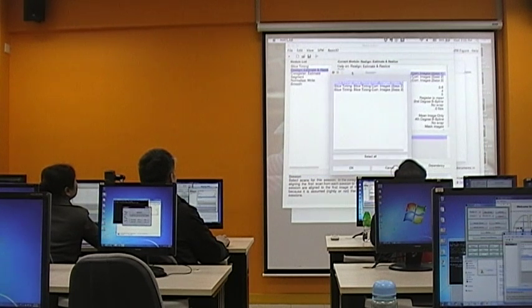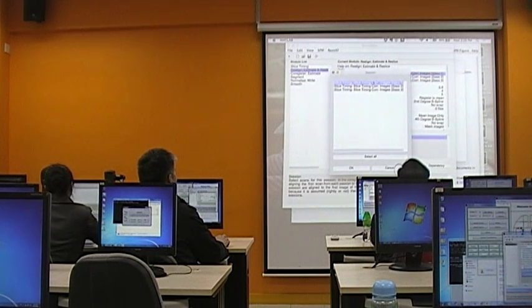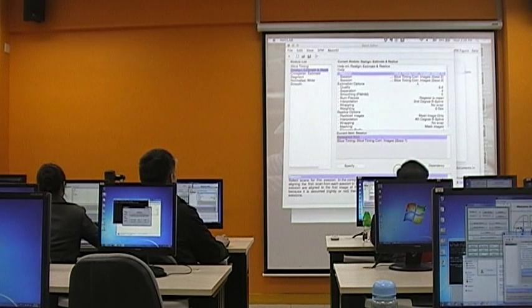When you click dependency, you will see any inputs from the previous steps appear here, so you can choose without even putting in the real data. Here I would like to use the slice time corrected images from session 1 as the images of session 1 for realign, and so on for session 2 and session 3.